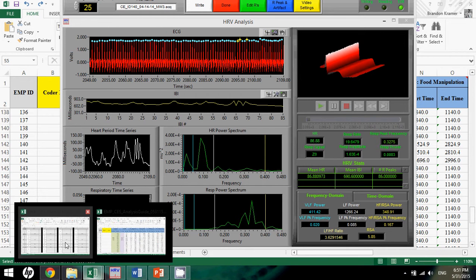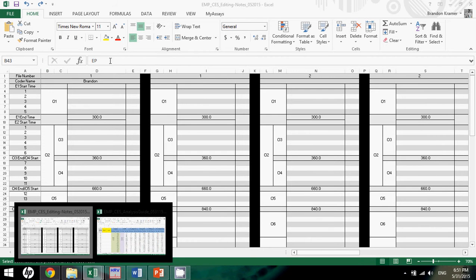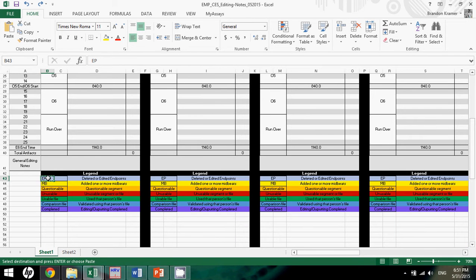So what we'll do for the time being is we're going to mark this process. Typically what you do is, if you were conducting E1, section 01, and that was the first segment, for instance, you'd want to write that down in the proper channel or the proper marking spot. Here we'll just assume that's the case. What you want to do is copy and paste this. So click on the exact endpoint spot like this.